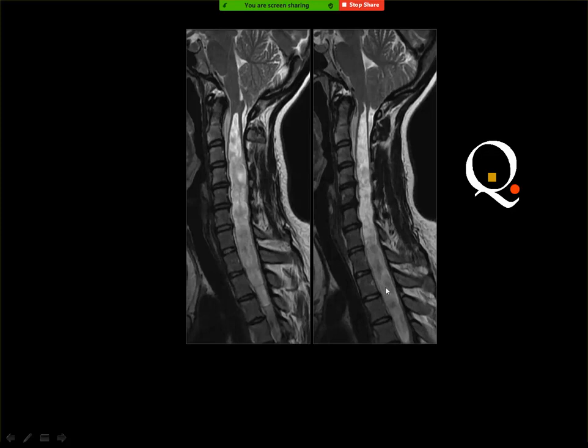Then you may ask, what about the abnormal signal within the syrinx? And this is due to turbulence. Neurofibroma. No. This is hemorrhage. No. This is due to turbulence of flow inside the syrinx because it is very big. Then if it is a narrow syrinx, the jet of flow will show normal signal. But if the syrinx is big, then you suspect that there is some flow artifact.